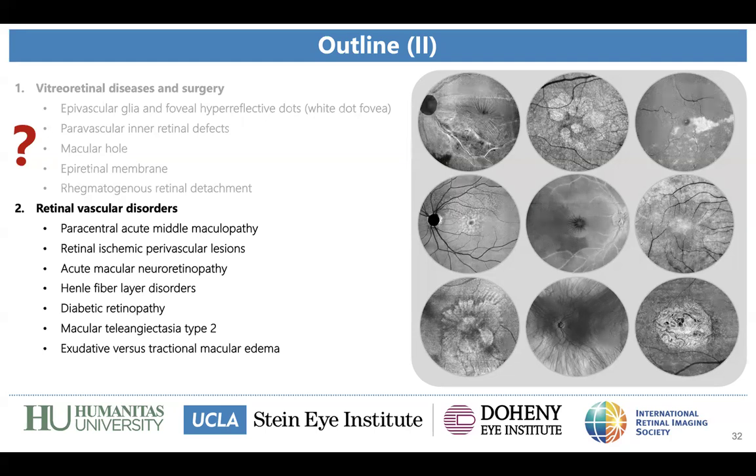The easiest way that I could think of is just to manually adjust the segmentation: point by point, select the layer that you're interested in, select the thickness of the slab that you're interested in, and just go from there. Of course, this is a limitation, and I hope that software advancement will help improve this point.